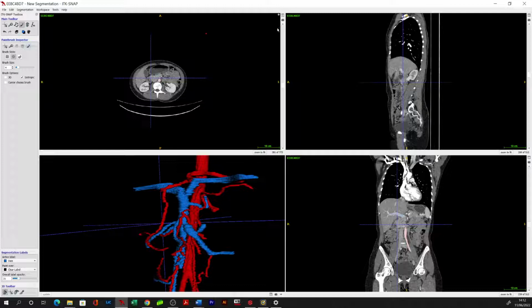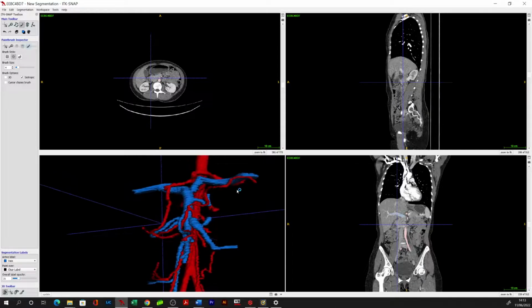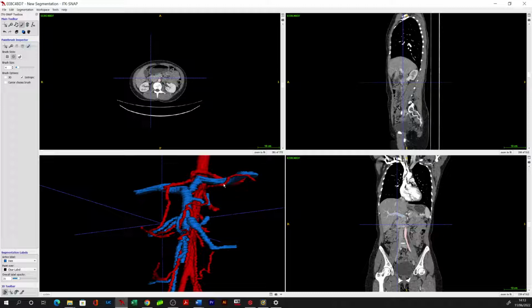So the middle colics, by definition, are the vessels supplying or draining the transverse colon, but given the degree of open interpretation as to what would be transverse colon versus splenic flexure versus descending colon, you could easily call this an accessory left colic artery as well. But given the common trunk in this case, as in you have this vessel which is emerging from this middle colic artery, this is likely going to be the left branch of the middle colic artery, as opposed to an accessory left colic artery, which you would define as a vessel that would be supplying the descending colon.